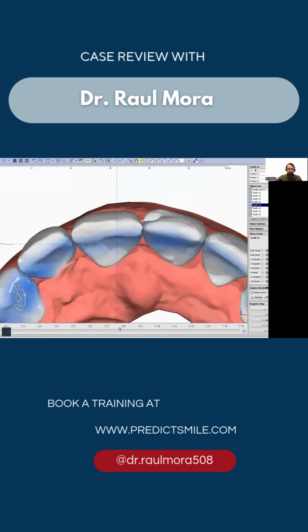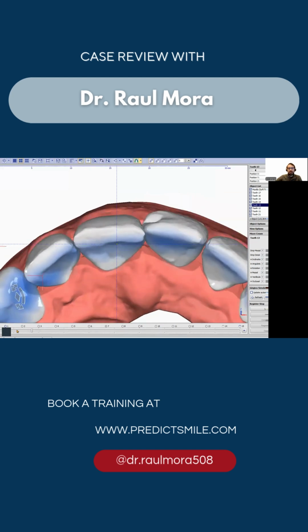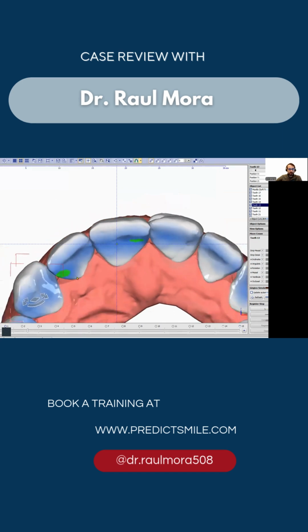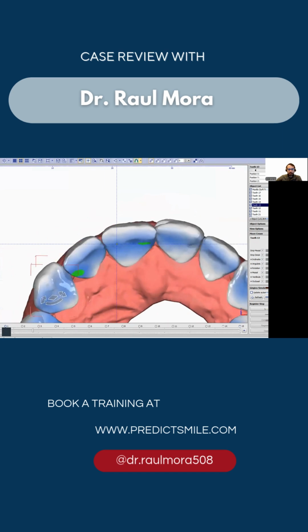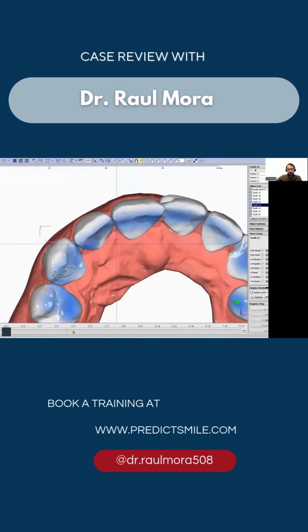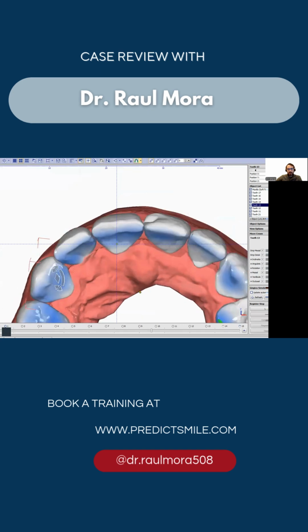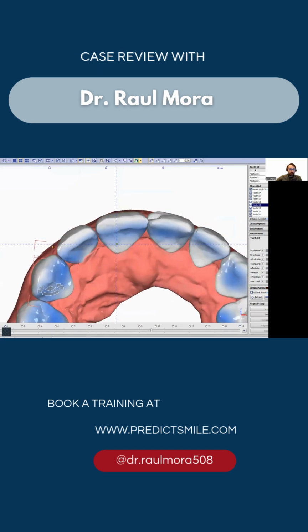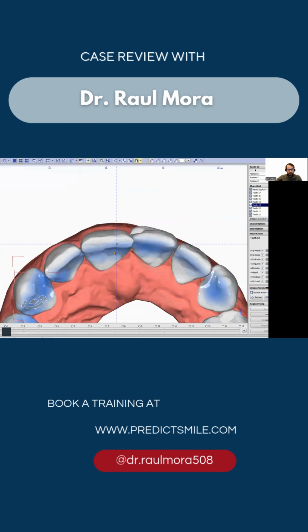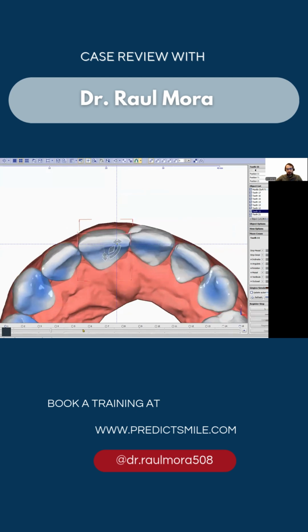And then we go to the central incisors. So we need to do this tooth by tooth. That's why making treatment planning takes so much time if you're doing good treatment plans, because I have seen many treatment plans where everything goes at the same time. They don't make any hinge movement. They don't create space. They don't use round tripping. So it's very important to create space before moving the tooth or, during the movement of the tooth, create space with the other tooth. So let's see now the contacts that we're having here, 0.06, then 0.11.